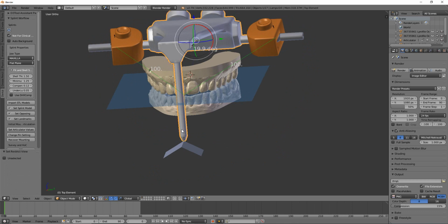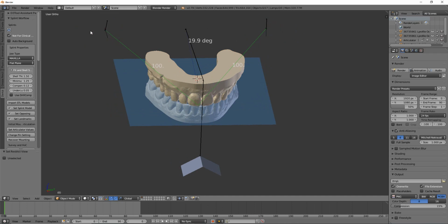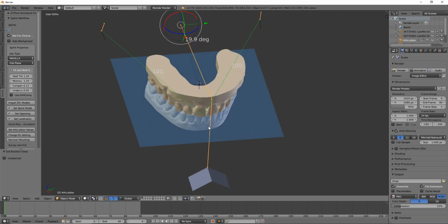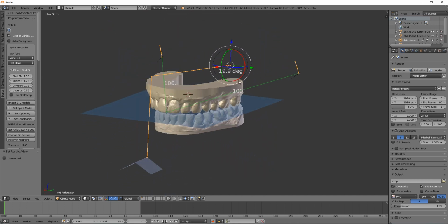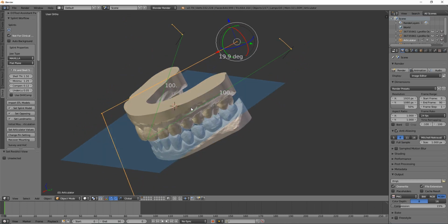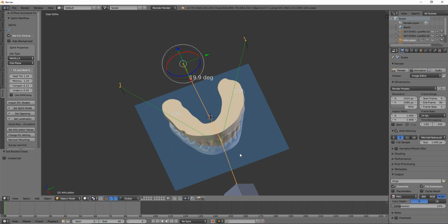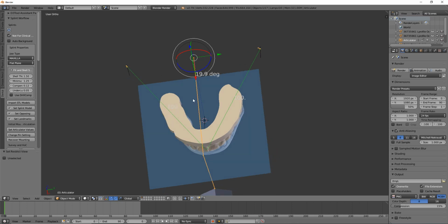Alright, under the hood here, all these objects are just decorations for a Blender armature. That's an animation data structure that allows typically for the rigging and animation of characters, so legs and bones and arms and things. And so some elements of representing a dental articulator weren't well captured here. I was driving two condyles down each path and then determining the rotation in the horizontal plane based on how these two condyles were pointing at each other.